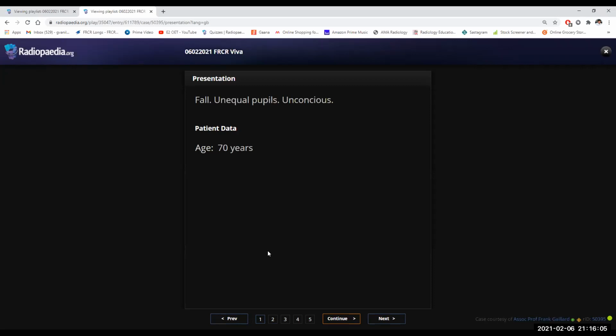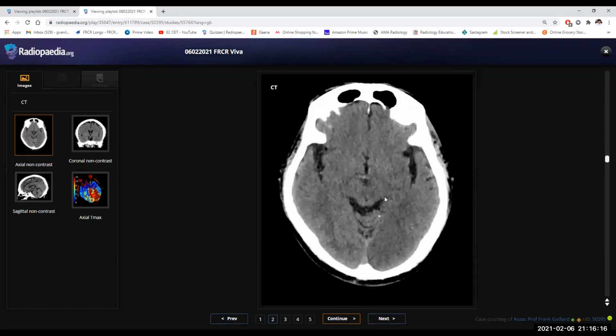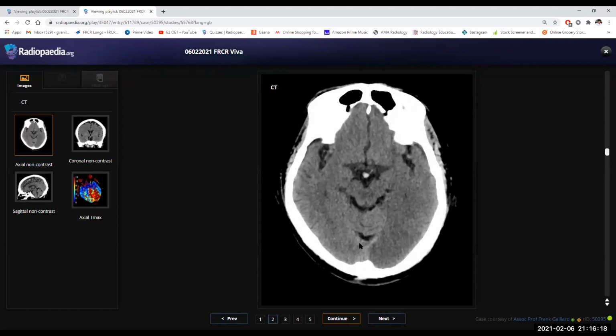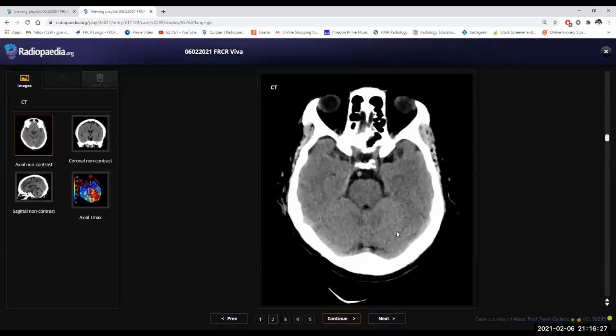The tip of the basilar artery is very dense when compared with the other arteries, and you can see the difference in the density of the cerebral parenchyma between right and left. You should follow the stroke protocol and alert the stroke team for further management.